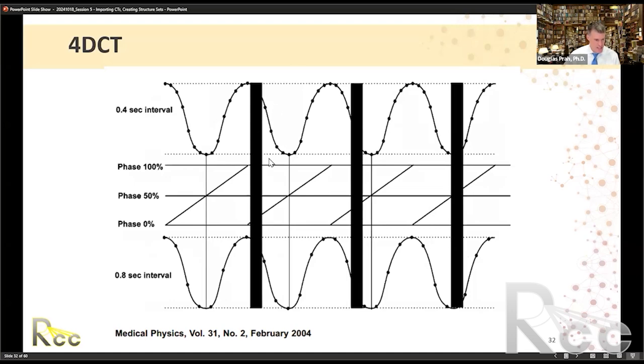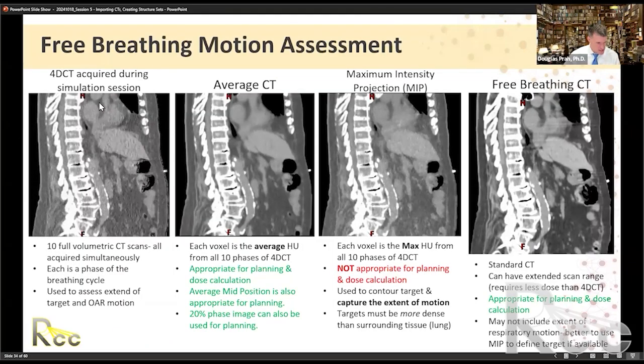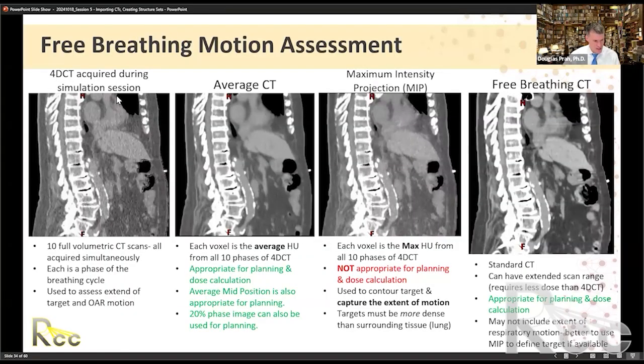And so the 4D CT, this is the 4D CT here. You can actually see all of the internal motion of the patient. And you'll see that some patients have a lot of volume in their lungs, and the diaphragm might move 3 centimeters, quite a bit. So if your target is on the smaller side, but you have 3 centimeters of motion, it's good to have techniques to make sure you're not missing your target.